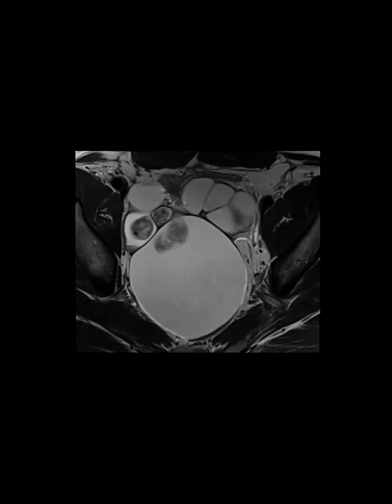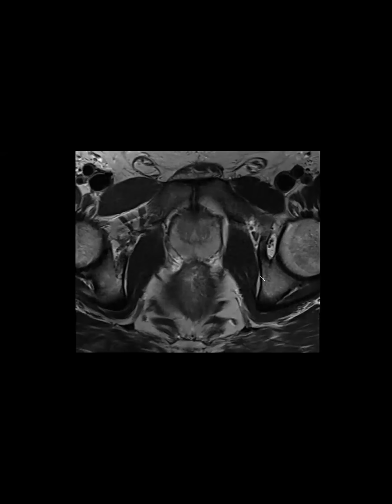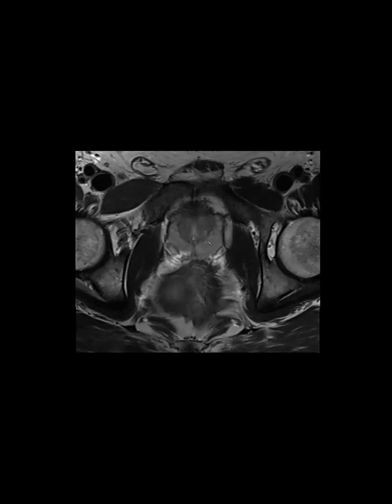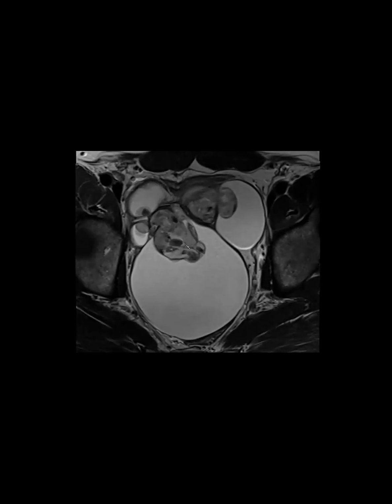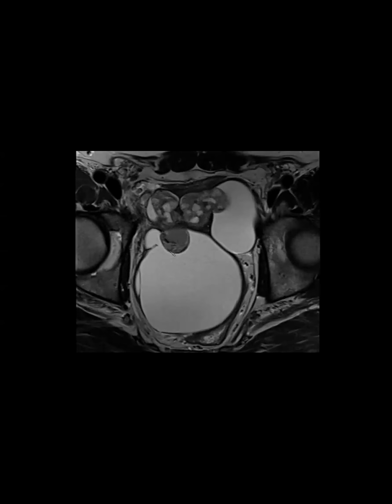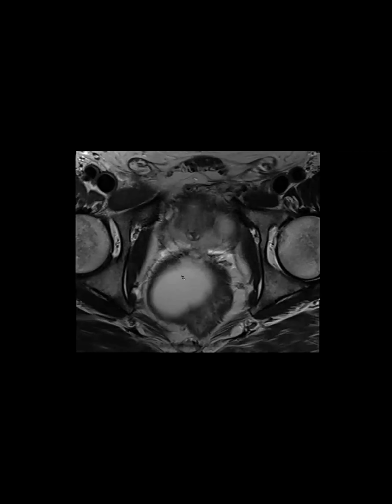And then I have one more case. This is a cool one. Prostate MR, you can see the prostate here. And then we have this large lesion affiliated with the top of the prostate. It has cystic areas, and then these areas, which I will tell you in retrospect are very suggestive of what this is. Someone's typing into the chat.